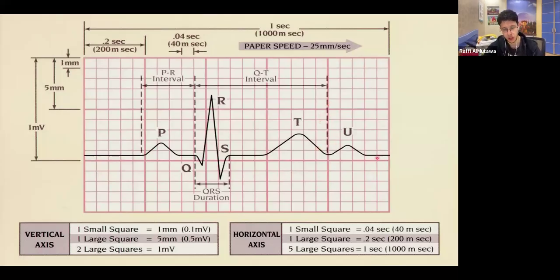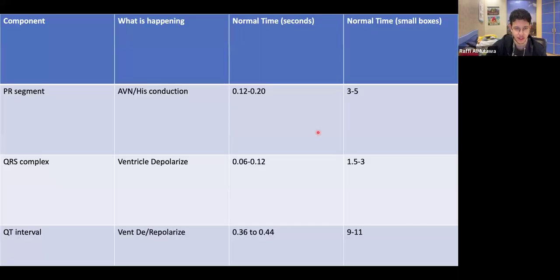This U wave, do not remember this right now. This represents a disease called hypokalemia, so when potassium is low, and it represents an abnormality of repolarization. This we'll talk about, the polarization, repolarization. I believe it's this slide. Yeah, nice, this panel. Okay, so starting off with the PR segment.